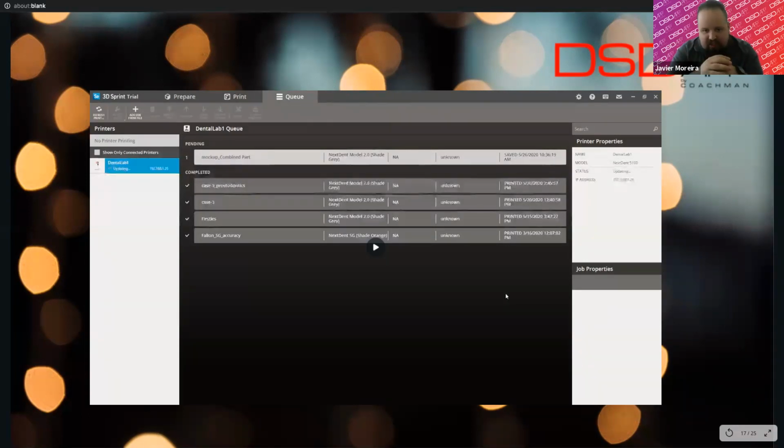And as you can see, the video finished just there. But I believe in the next one, you'll be able to see us actually print it. The printer that we're using, since they are our partner, we've been testing it very thoroughly with our app, and we have gotten some pretty amazing results.